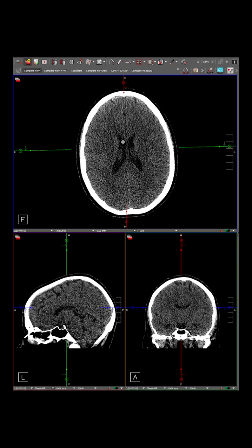If you want to get rid of any study annotations, which I've already removed quite a few of to be HIPAA compliant in this video recording, you can press spacebar to get rid of some. And if you want to toggle the middle of the crosshairs, you can press X. Okay, those are some key things for just visualization.